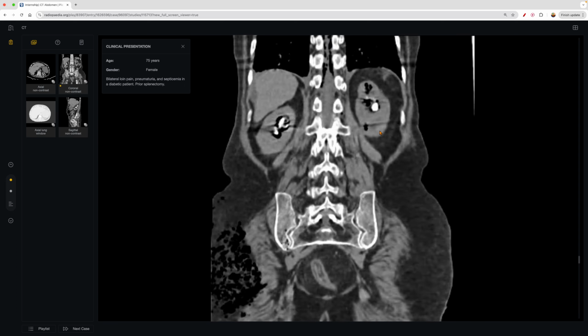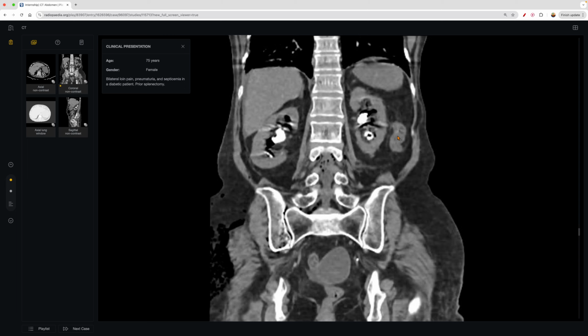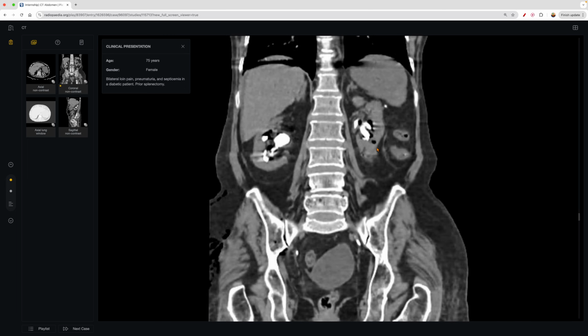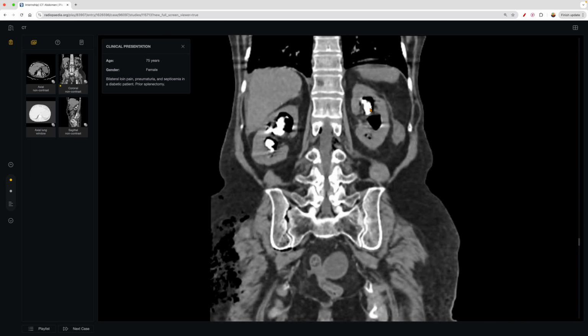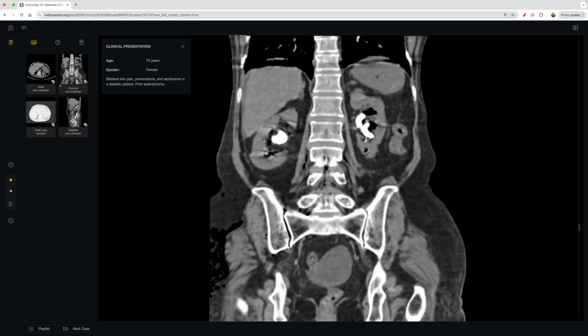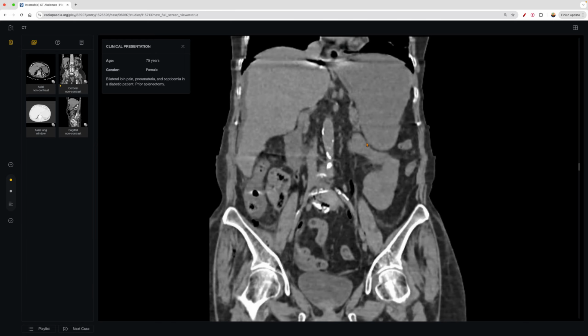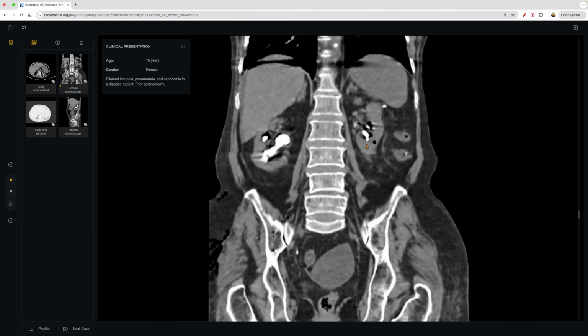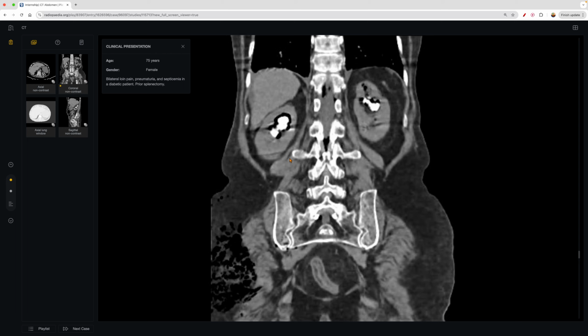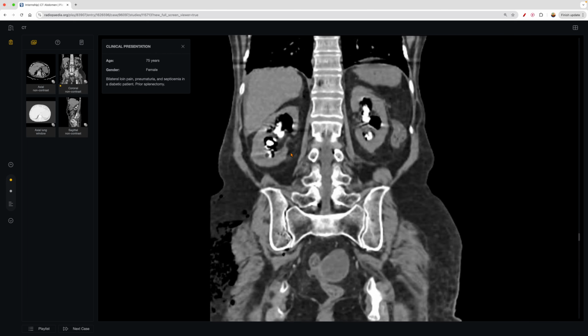And certainly in this patient, aside from all that air in the leg there, we're not going to talk about that one, but they have what we call emphysematous pyelonephritis. So there's actually air accumulating within the kidneys themselves due to infection. And that is something I've seen surprisingly multiple times in a clinical rotation as a medical student. So it's not entirely uncommon, and it's certainly easier to appreciate given the fact that there's air.